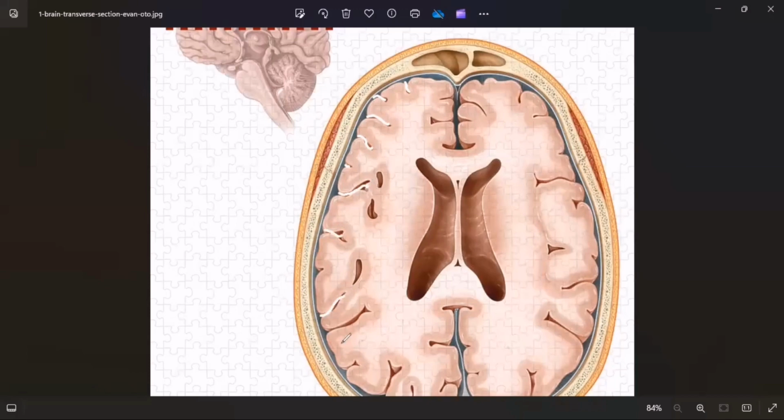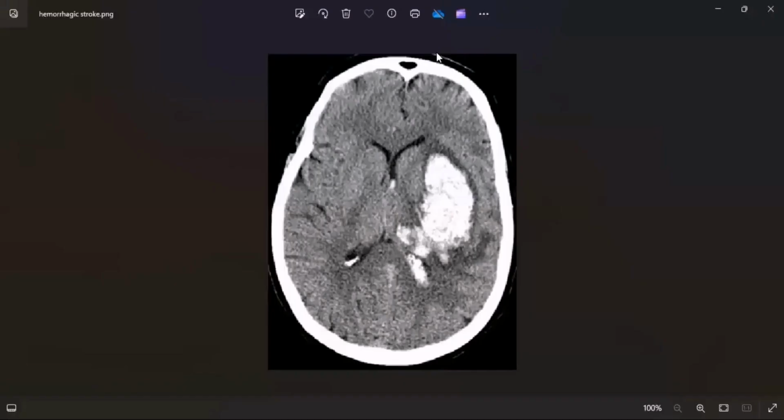This is what I'm trying to teach you. So these dark spaces, they are just spaces between what? The gyri. Do you understand? Yes, Doc. Good. So let me show that again. If I show you this, you'll see that these are the spaces, okay? You see that one here. Do you see one here? Another here. Can you picture that? Another here. So the spaces between the gyri.